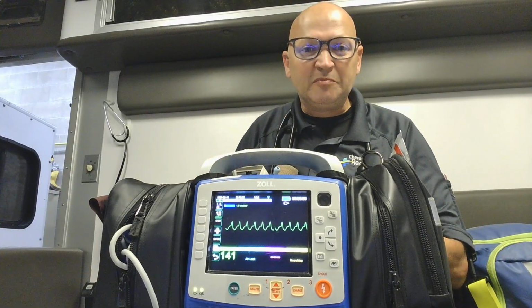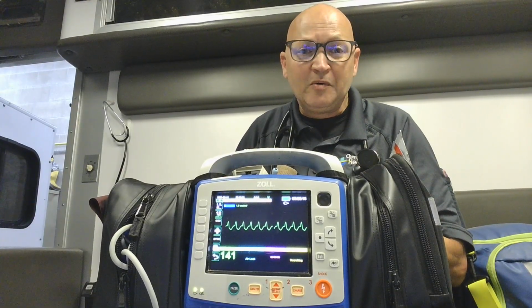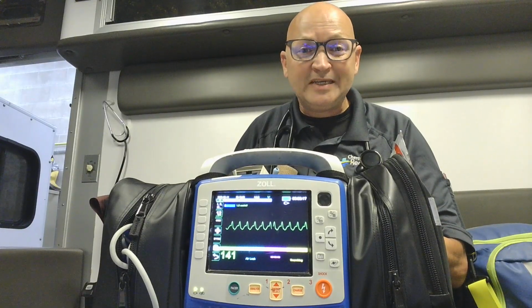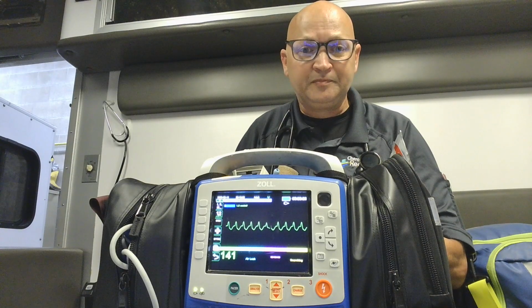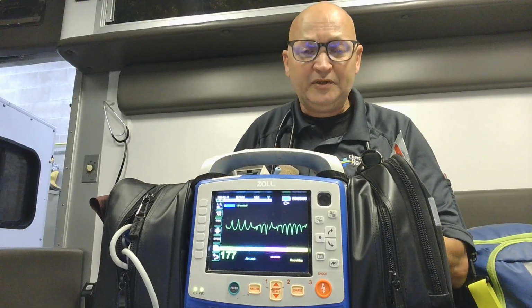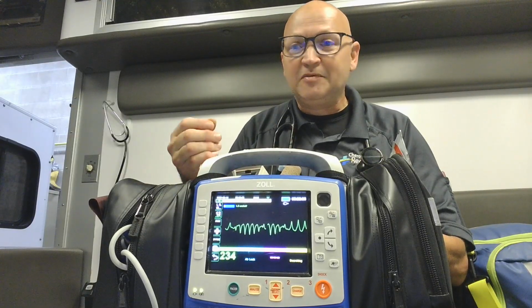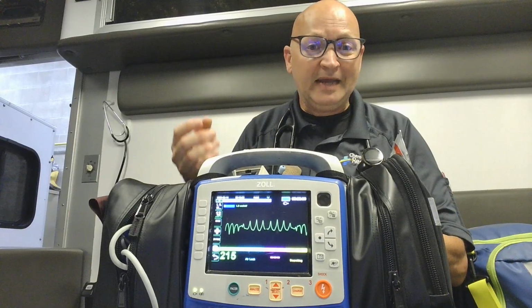The next one is known as polymorphic ventricular tachycardia, also known by its more frequently used name, torsades. Torsades de pointes means twisting of the points. So take a look at the electrocardiogram in front of you. You see it go up, and it'll go down. It'll go up, and it'll go down. Torsades may or may not produce a pulse, depending on what is going on. The reason for this is a magnesium deficiency, so the treatment of choice is magnesium.